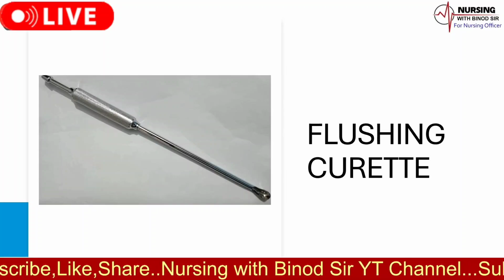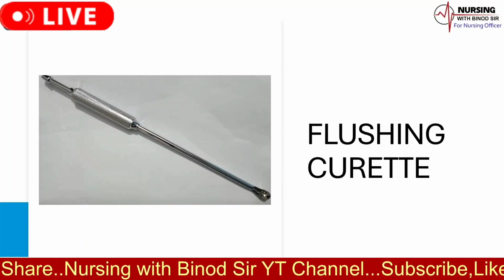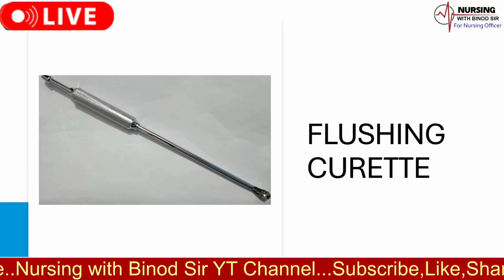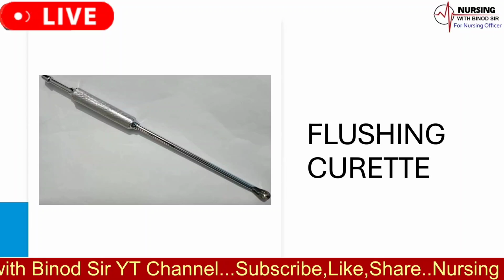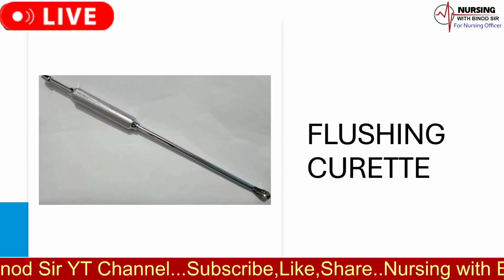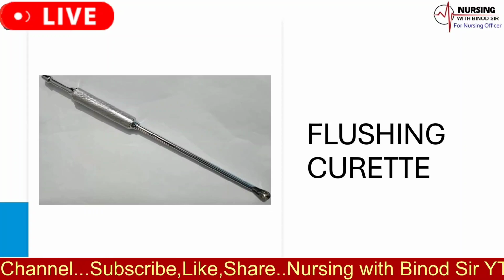The uses of flushing curette as follows. It is a blunt curette used in the operation of D+E. Previously, it was used to flush the uterine cavity with lukewarm antiseptic solution passing through the communicating channel.